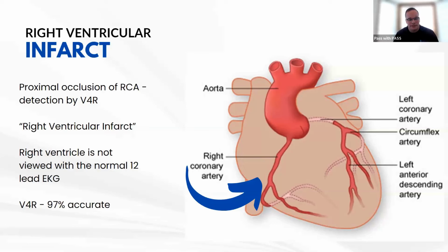So if my right ventricle is infarcting, as demonstrated by ST segment elevation in V4R, it's obviously not doing well. It's not going to be able to do its job as effectively as it needs to. And now with nitro, I'm vasodilating and causing lower pressures, and I'm making that right ventricle's job harder to pump blood to the lungs.